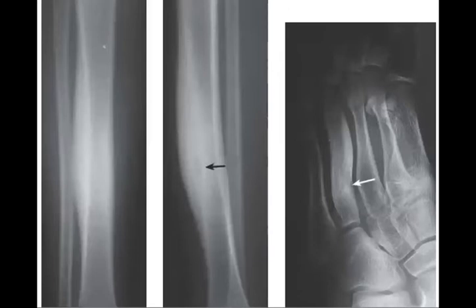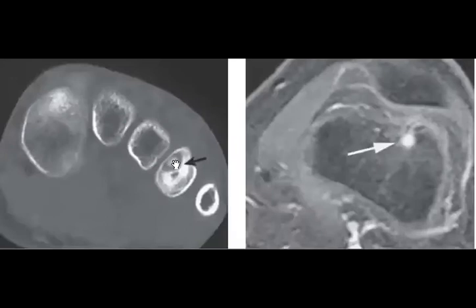Yeah, and they like to show you something in the CT, maybe like this appearance, which is a much easier one. Yes. So you can see the nidus, which is here sclerotic, and the lucency surrounding, and in the MRI as well. Okay? The nidus enhances in MRI. Okay, so let's shift to another case. I think this one is easier. I think all of this will be fine for you.